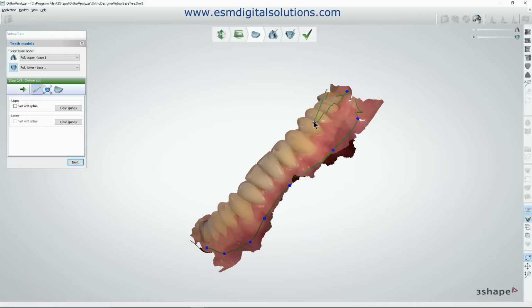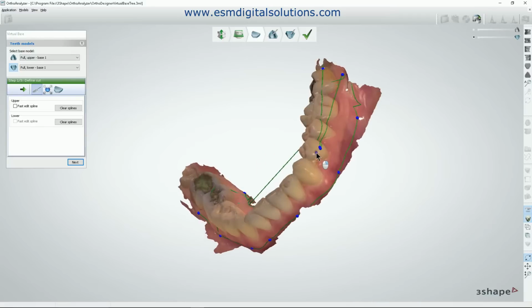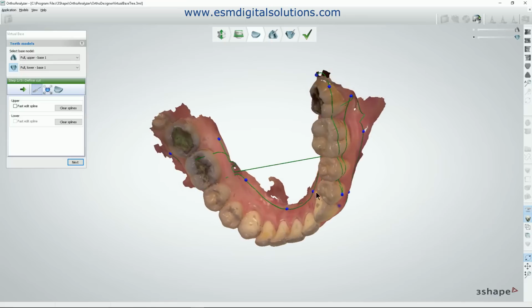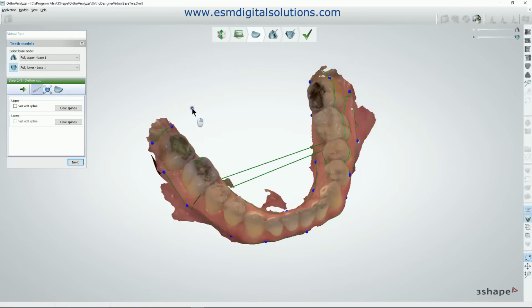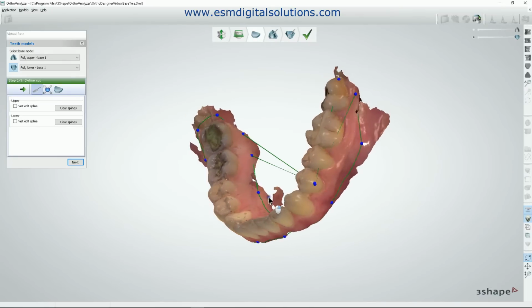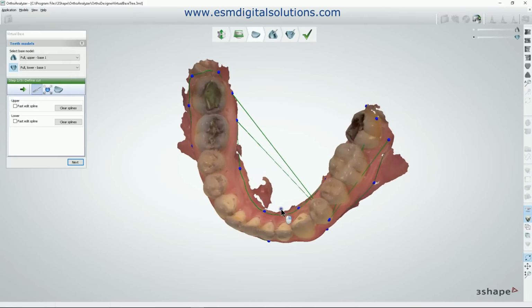It's not possible to click and drag a point in mid as we're selecting all the points. We can't move a point until we have closed off the loop. So in my attempt to click on that point to move it, I've actually created another point. So again, let's forget about those additional points and just work our way through and click on the first point again, and you'll see that the software straightens everything out.